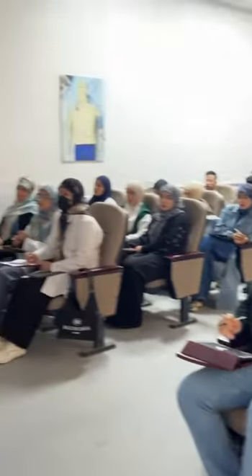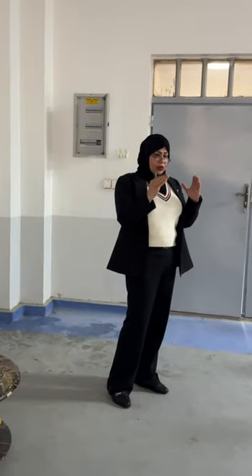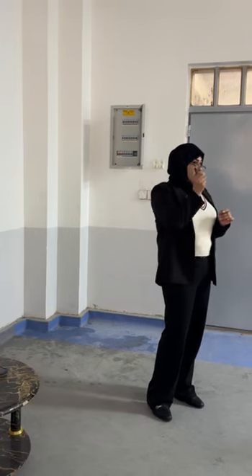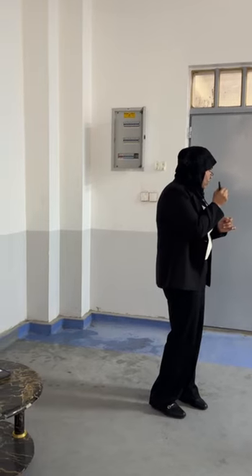Doctor, it is a ureteric stone because it will be close to the spinal cord. If it is renal, it will be away from the spinal cord. Normally, the kidneys' upper poles are approximated to the spine and the lower poles get away from the spine. So the more away a radio-opaque lesion is, the more it is regarded as renal; the more approximate, especially if it passes over the transverse process of the vertebra, because this is the course of the ureter, we can confidently say it is a ureteric stone.